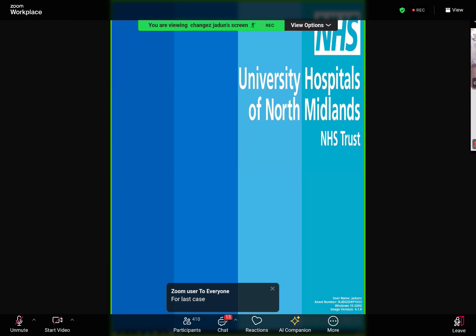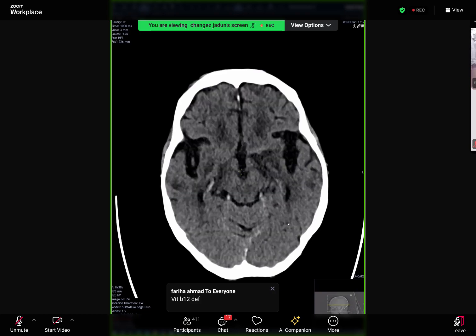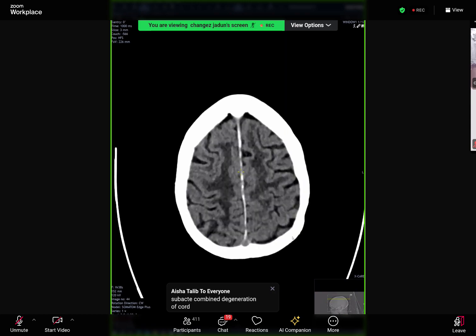Okay, so this is a patient who came to us with unwitnessed fall, loss of consciousness, bilateral orbital bruising, nasal query fracture, hypertensive, low heart rate, rule out intracranial complications. I'm reading the exact history. Okay, start from the top.